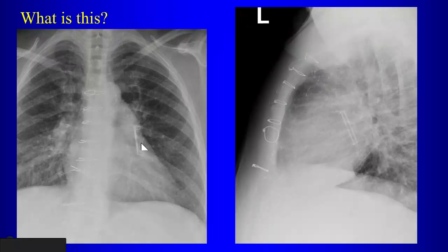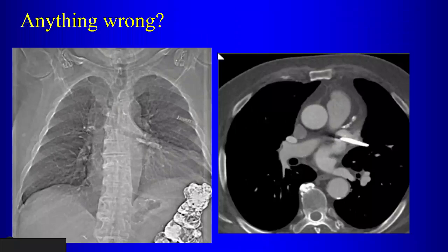Right? This thing, atrial appendage clip. Yeah, so that's an atrial appendage clip, or an AtriClip. Now this is placed outside the atrial appendage, so it has to be done while they're doing cardiac surgery. The patient has had a sternotomy, and you have a patient with atrial fibrillation who could develop clots within the left atrial appendage. So while they're in there, they can put the clip over the mouth of the atrial appendage so that those clots, or any clots that potentially would form in the atrial appendage, are now excluded from the blood pool. That's an atrial clip.